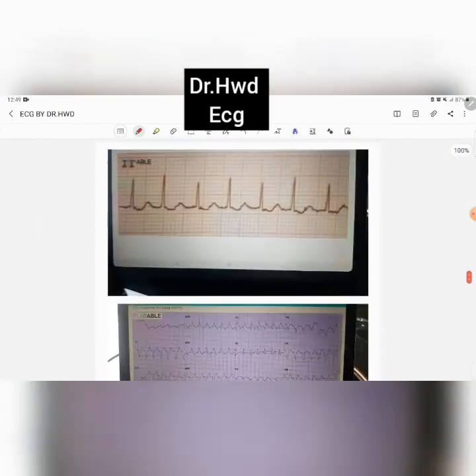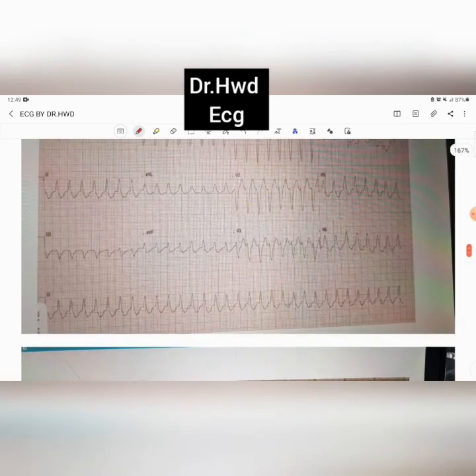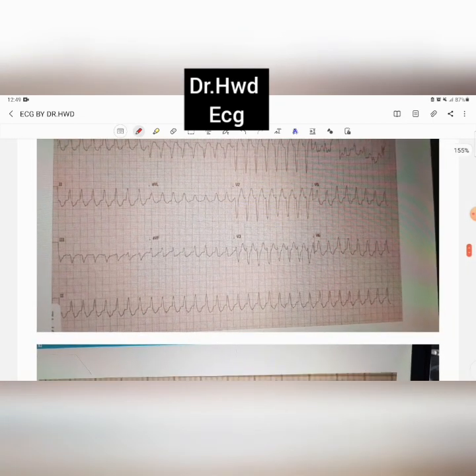All right, now let's look at the other ones and let's look at the tachycardias. Right, let's look at the tachycardias, and which is this one? I'm gonna give you a minute to just look at it. I know you guys aren't there, but I'm hoping you guys are listening.